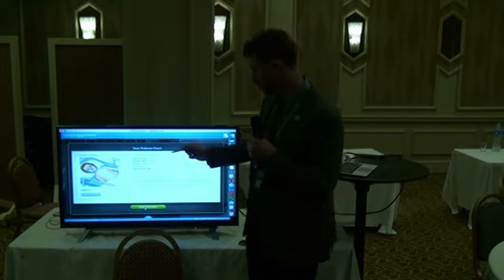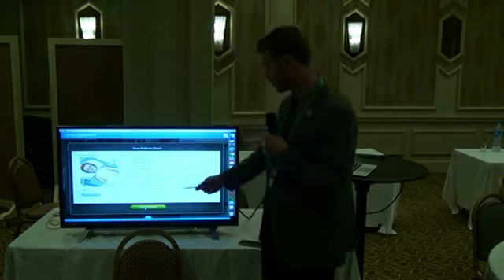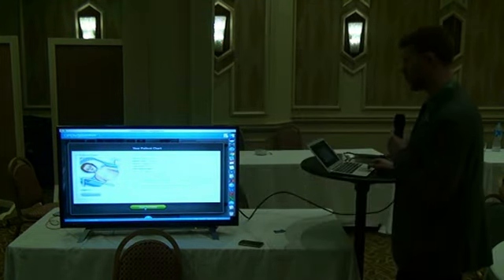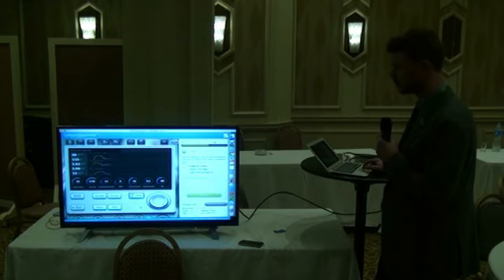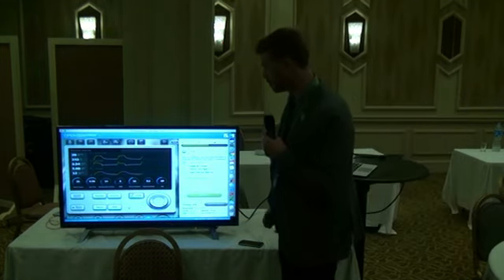All right, so this is a kid in the PICU. We can see the most recent ABG here, 12 years old, admitted for status asthmaticus, and we're called to the bedside because the patient seemed to be working a little bit harder to breathe, which is a subjective assessment, but you can sometimes tell. Okay, so how about this one?